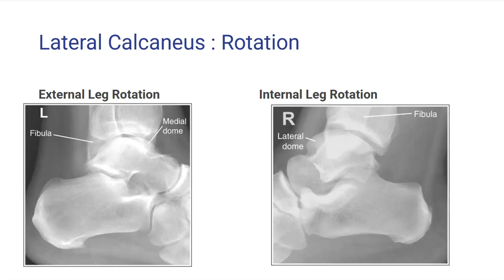Conversely, with internal leg rotation, where more pressure is applied at the heel, the lateral talar dome will shift anterior to the medial talar dome.